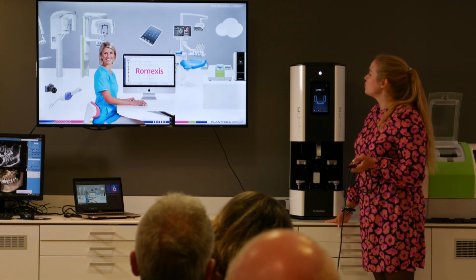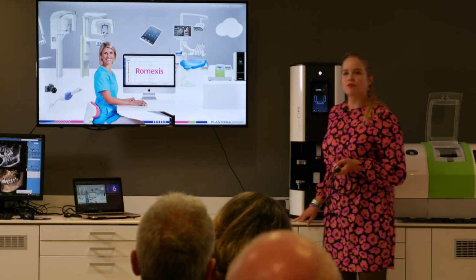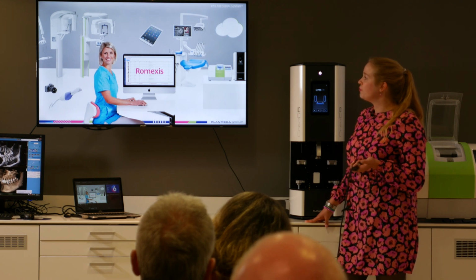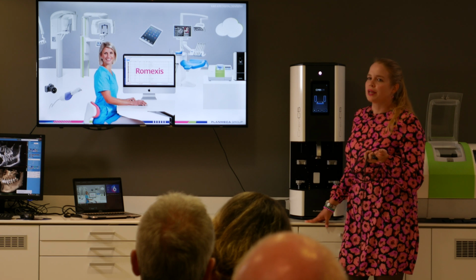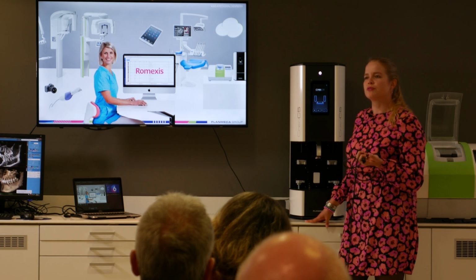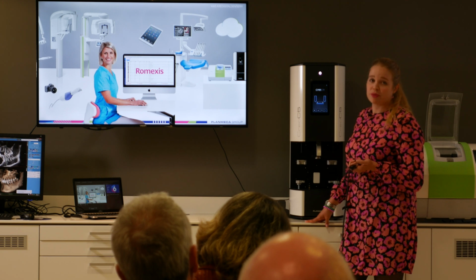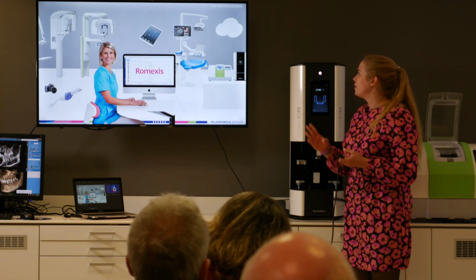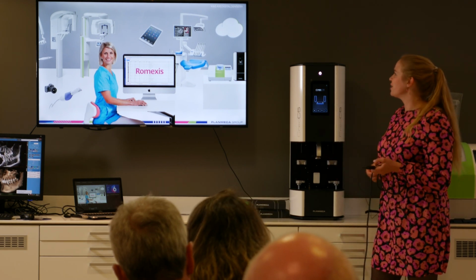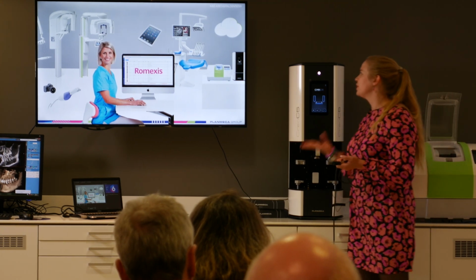And what else we have still, like said, we could take a look at how Romexis 6 will look like. So like said, we will release it later this year. It won't be too different from the previous. Now the current version in market is like 5.3 point something. We have released a couple of minor versions, so 5.3 basically. So for the functionality part, it hasn't changed that much. We don't want to change Romexis too much because we don't want our existing users to feel confused.